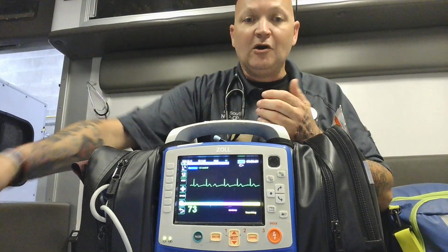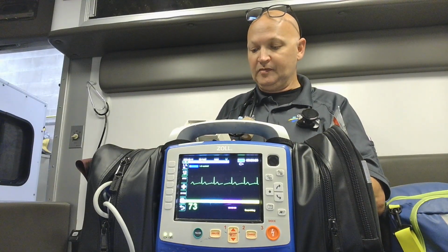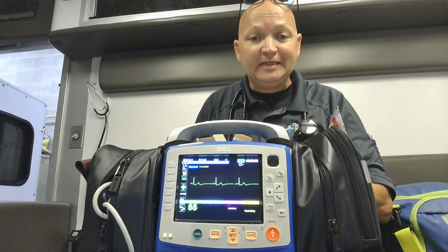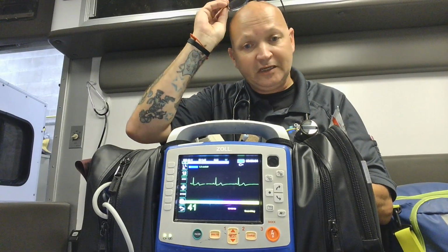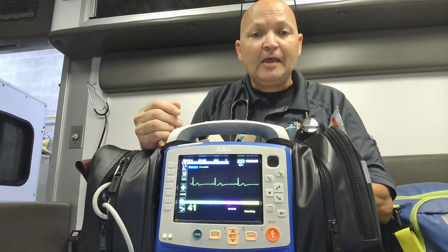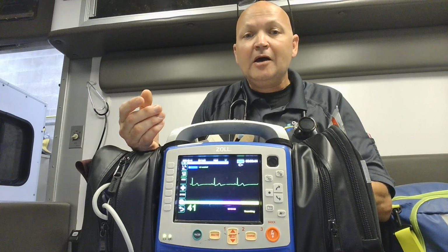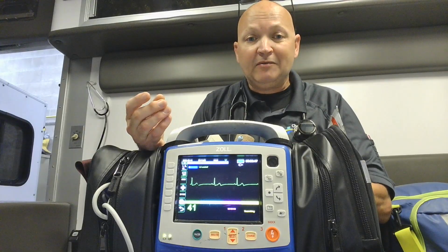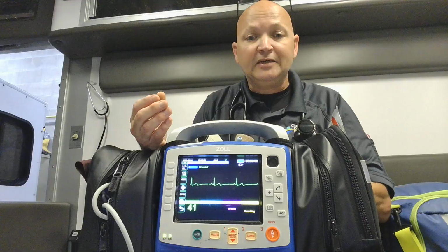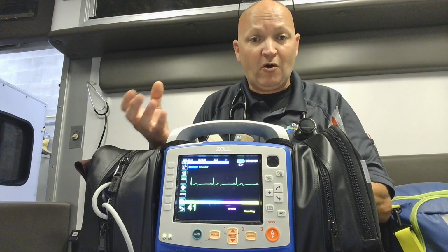Now the heart can go just a little bit slower. This rhythm is known as bradycardia, which is a rate of less than 60, and you can see how the rhythm slows down. We have a heart rate of 41 showing right there. Bradycardia can be a normal finding in patients who are athletic. But if a patient has symptoms of bradycardia, say a patient who comes in with chest pain, shortness of breath, or weakness, and they're bradycardic, we may have to give them medications to get their heart rate up.